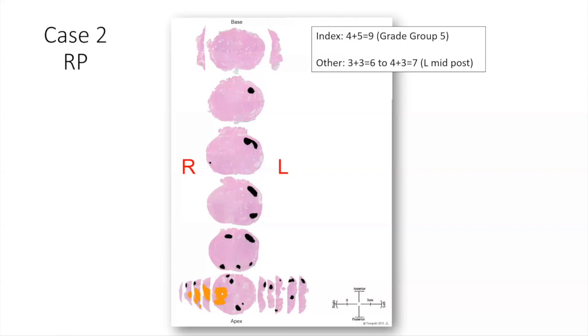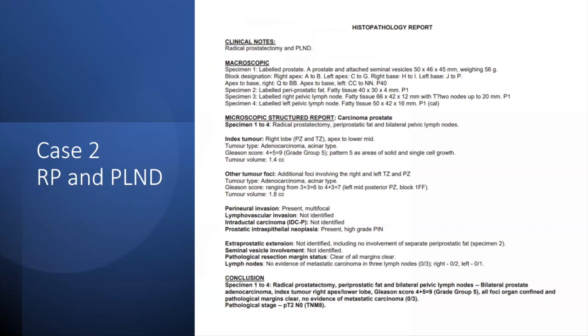And then this was graded as 4+5. So I know we called it grade group 3 in the original biopsies, but obviously there's a component of pattern 5 that wasn't picked up on those original biopsies. What do you make of that upgrading? Well, that's pretty easy to do, because all you've got to do is slightly undersample an area that has some pattern 5, and it doesn't take much for me then to tip over into a grade group 5.